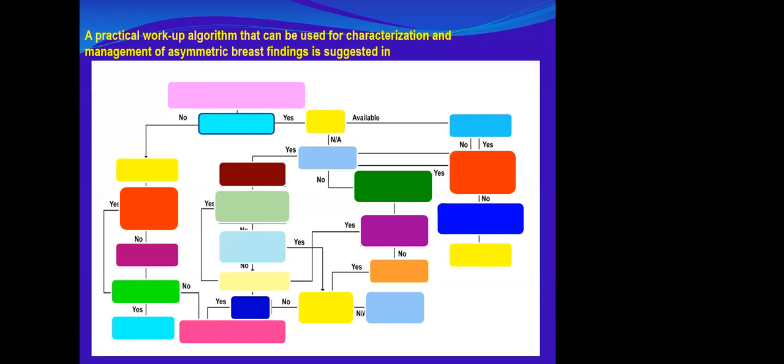Just a revision of the practical workup algorithm for characterization and management of asymmetry. As we mentioned, for asymmetric findings, we have to look at whether it is seen in a single view or two views.